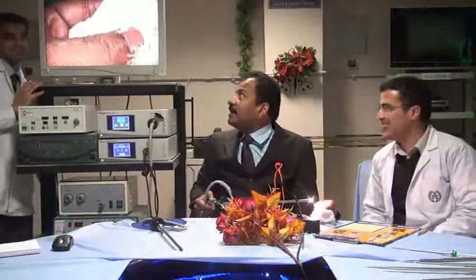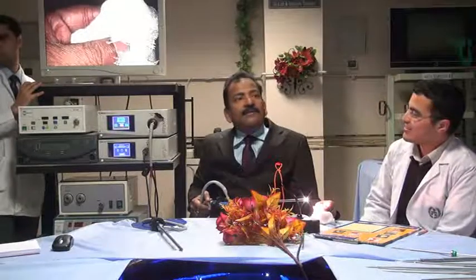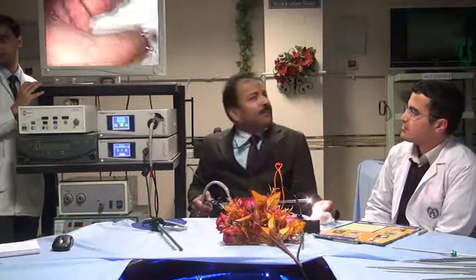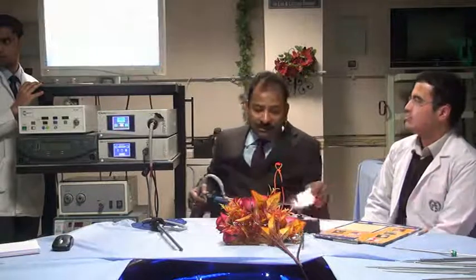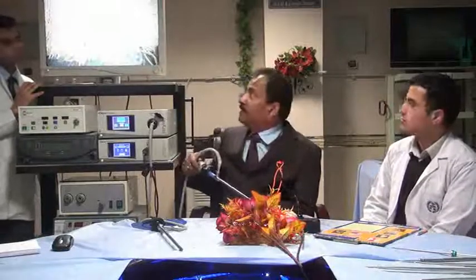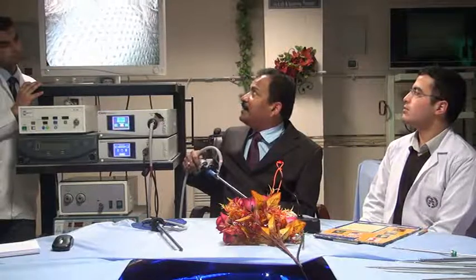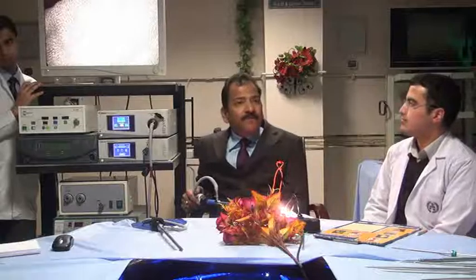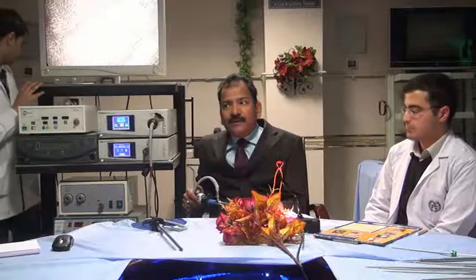You know why? Because the camera will consider the finger as an impurity, and it will add a counter color of my skin color to remove this, and then your white balancing will be wrong. Suppose I am holding like this and doing white balancing this way. The camera is confused. It will consider this color as white, isn't it? And all the colors are wrong. So during white balancing, your entire screen should be white.